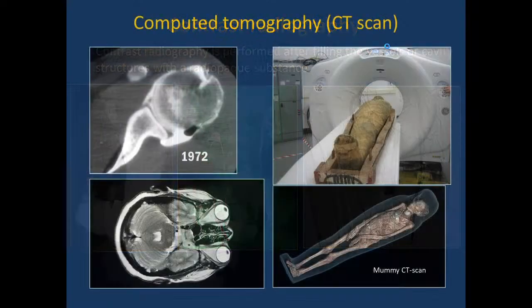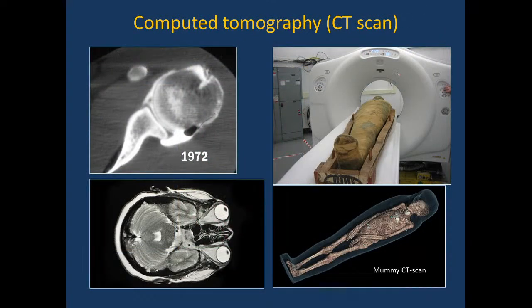Then I'd like to show this picture again. This is a picture with the technique called computed tomography. More often we call it CT scan, like here. And this computed tomography is a modified method of X-ray examination. It is a very important research method in the clinic, especially now during the period of the COVID-19 pandemic situation.